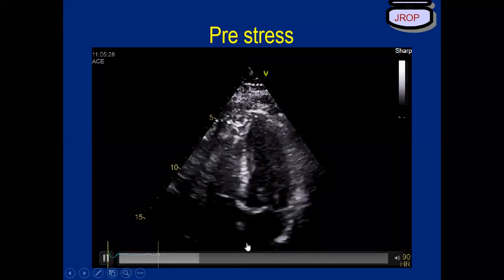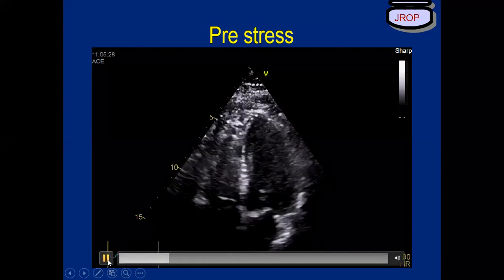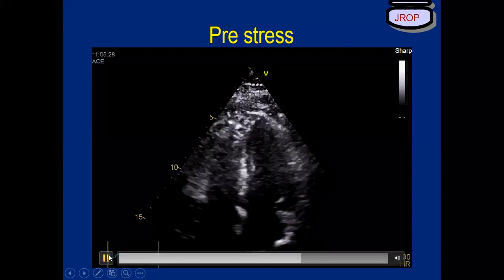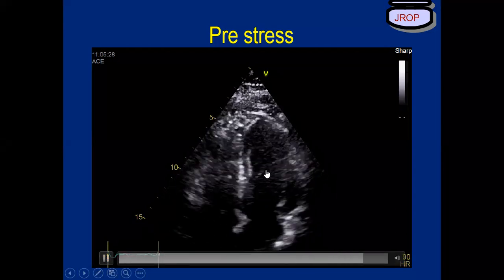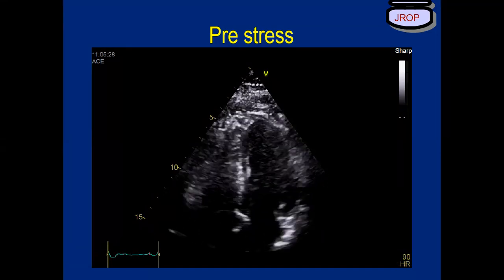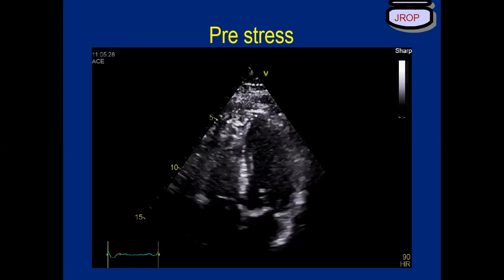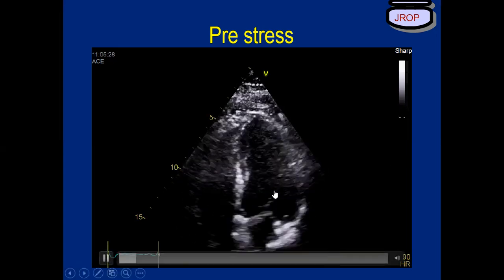Look, I'm going to freeze this AML cord. When the picture plays, the cord goes up to this point. Look at this point. Yes, sir. This is all cord. Correct? And during every contraction, they are crisscrossing each other. Now look at this. They're crisscrossing each other at this point. They're crossing like this.